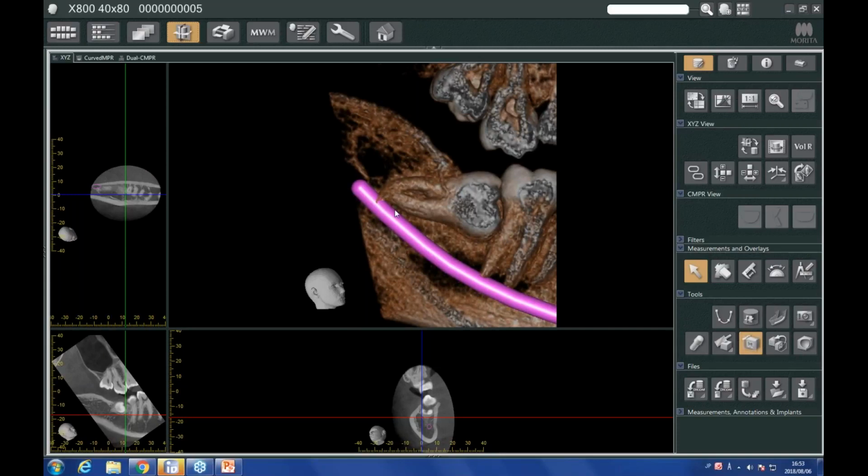So again, this volume rendering along with this dynamic cut is a good way to show the patient why you're choosing a particular treatment, or to encourage them to choose a particular treatment and be very well aware of the risks beforehand. So this basically concludes what I'd like to say for i-Dixel.